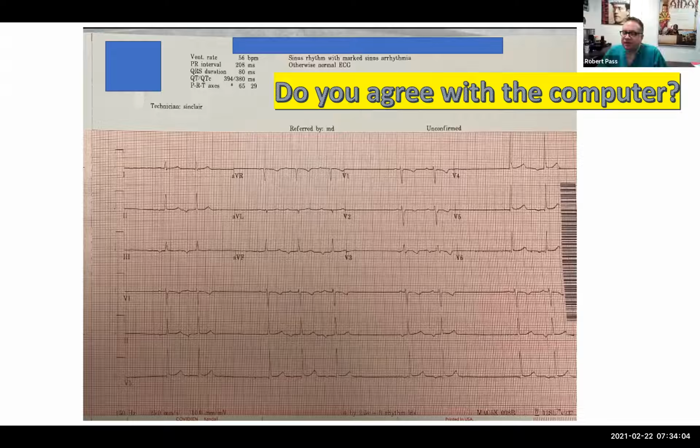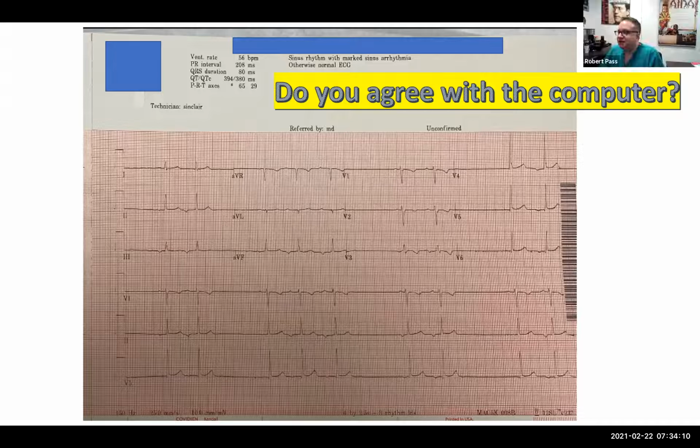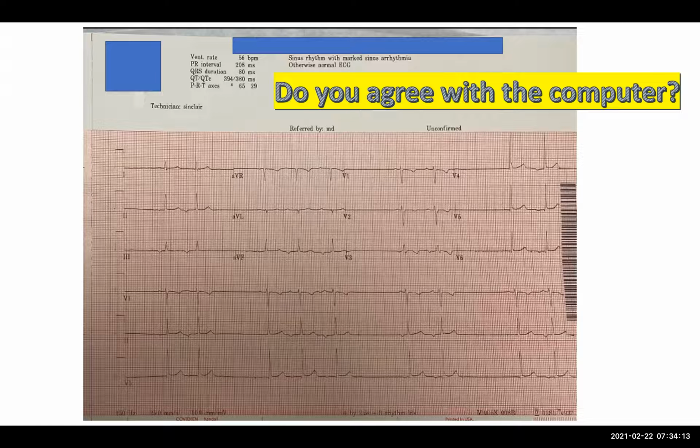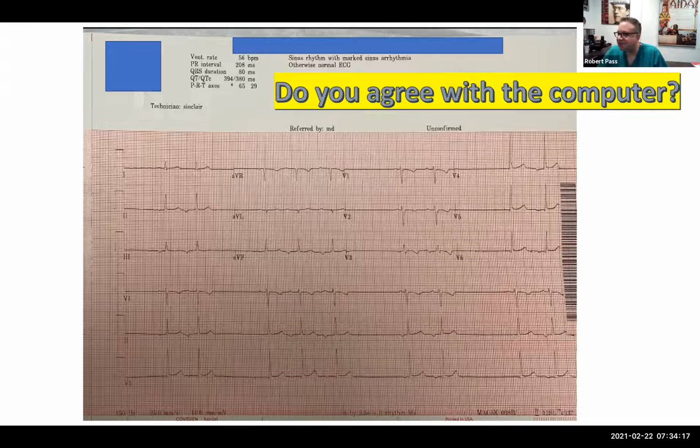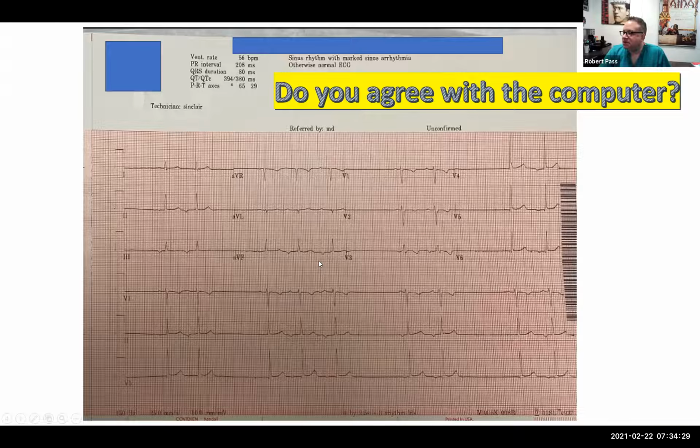So this is very similar, right, to the other tracing. First one, yeah. Right. I want you to feel like we're reviewing things and re-reviewing things. Very important to be able to use the data you just learned to inform new information, particularly for a catheterizer. So that's why I decided to ask you this question again. Right, so this is again sinus with an ectopic atrial focus, and just a nice tracing of that.